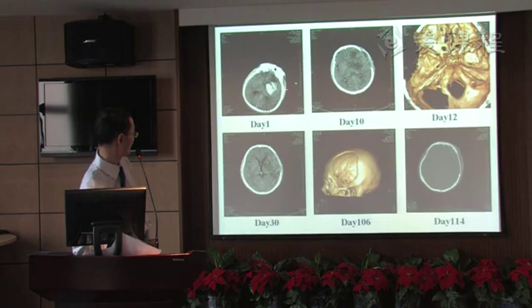This is the first CT scan of the patient. The patient underwent craniectomy and evacuation of the hematoma. On the 12-day CT scan, we can see the skull bone defect. 30 days later and 3 months later, the patient underwent cranioplasty surgery.